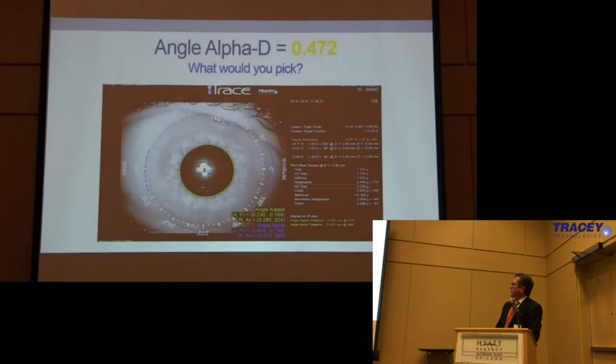So now she wants her second eye done. So here we go. Now we're falling into more of, we're within the ½ a millimeter on angle alpha and angle kappa. So they're actually lining up a little bit closer together. And in this eye, she wants to have a little bit better near vision. So what would you do?